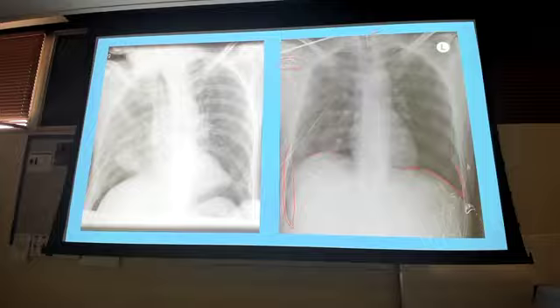I'm going to tell you this was a pneumothorax. Why? Supine chest x-ray, deep sulcus sign. Remember back to the pneumothorax lecture. Bringing it back. I know it's been a couple of weeks, right? We talked about that deep sulcus sign, specifically in supine x-rays with patients who had pneumothorax. That's what's going on with this costophrenic angle here on the right. That is the deep sulcus sign, compared to the left costophrenic angle, which is where it's supposed to be.